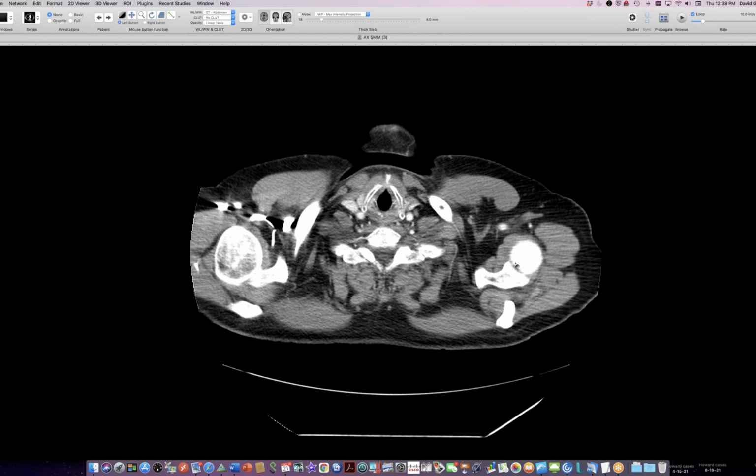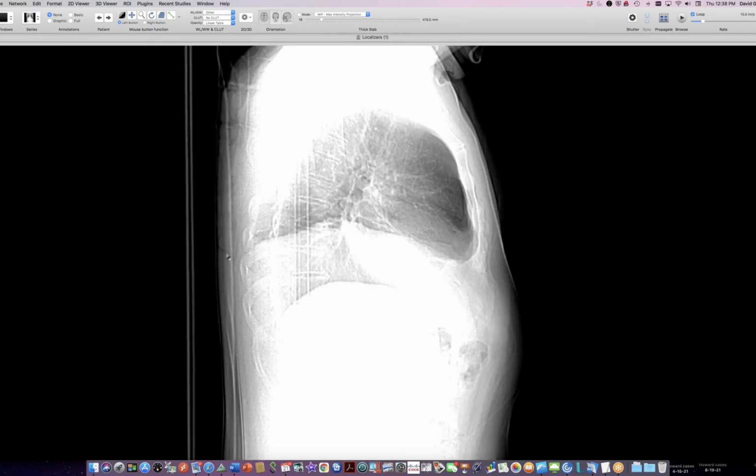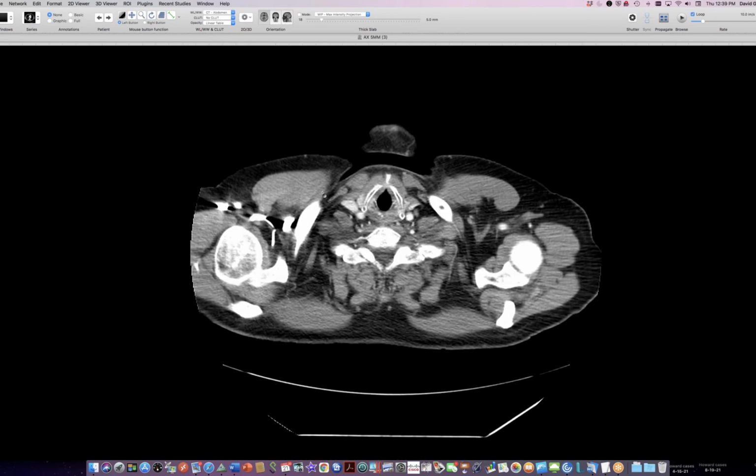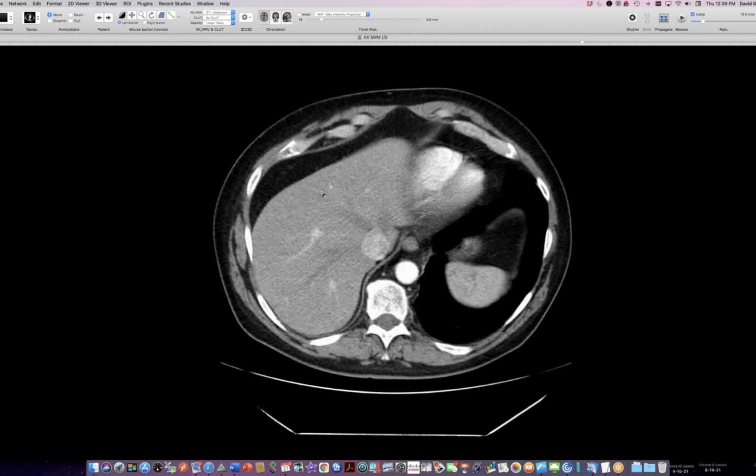And let's see. This man, I don't have an early chest radiograph on him, but this man has an elevated right hemidiaphragm. This is an outside case, an outside CT at this point. And he does have this elevation. They didn't have a clear-cut cause for his right hemidiaphragm dysfunction. They said it was paralysis. Let's look at the cross-sectional imaging and check out the diaphragm muscle.